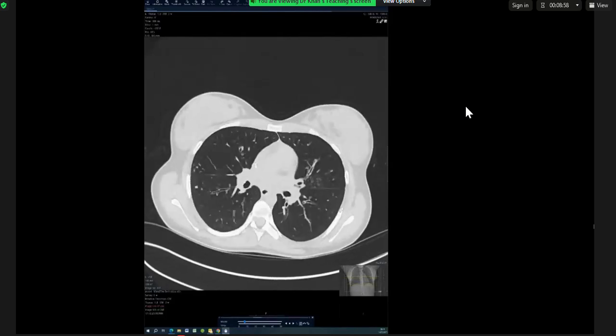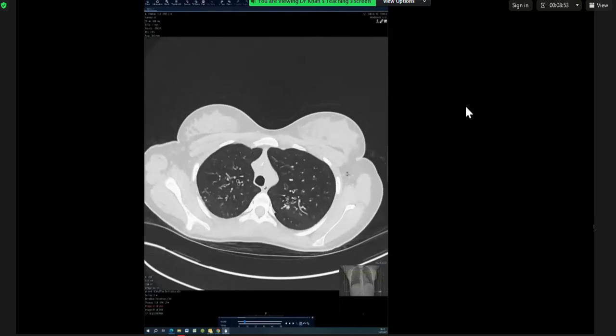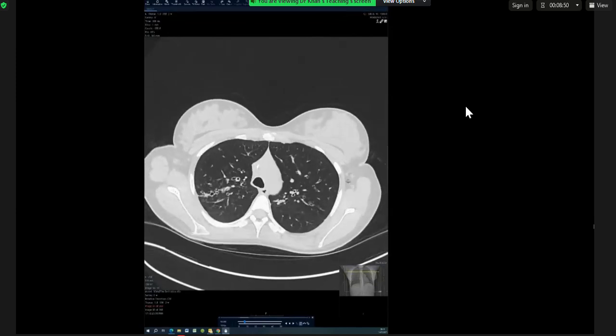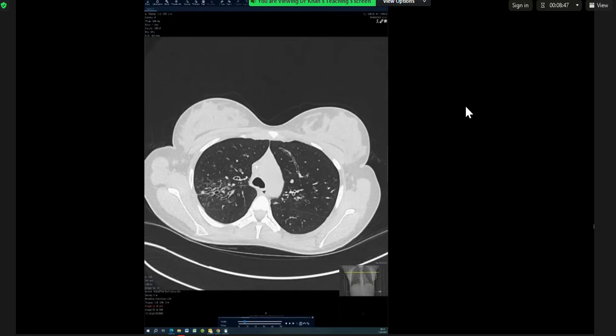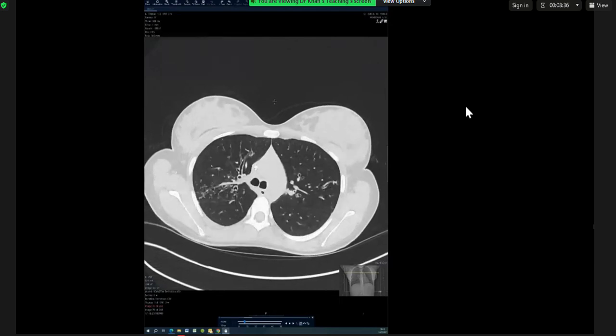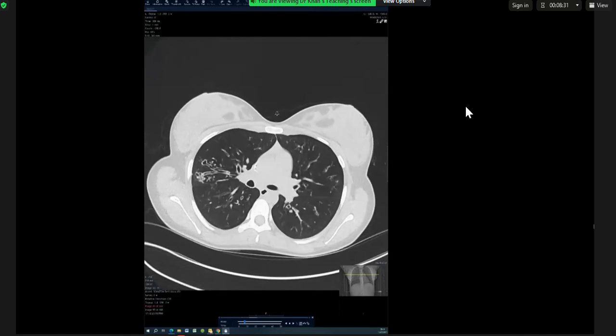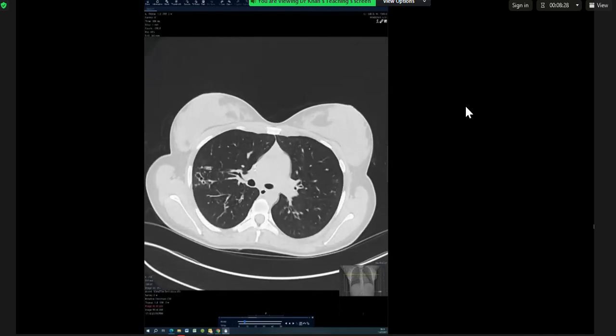So, axial plain CT scan of the chest: bilateral traction bronchiectasis with cystic bronchiectasis, most pronounced in the right mid-zone, where there are also associated patchy opacities that have the appearance of tree-in-bud nodularities. Bilaterally, there's endobronchial thickening and further thickening around the cystic bronchiectasis, raising the possibility of atypical infections in these patients.